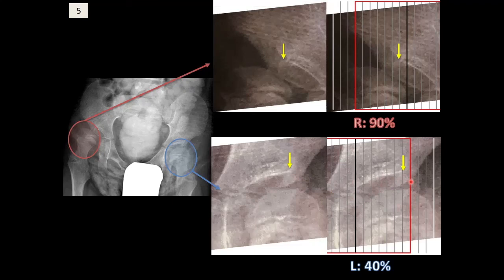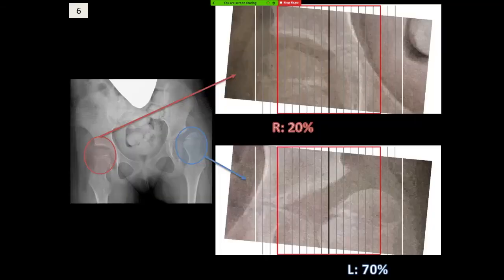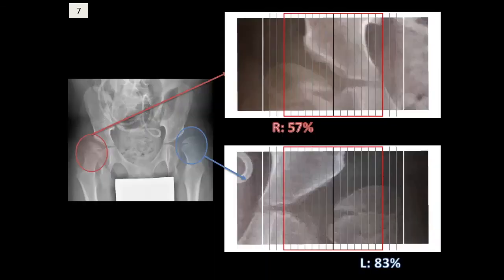The next 5 examples, I'm going to just breeze through with showing you the X-ray and then showing you the answer. And I'll leave it to you to take the time to do the measurements. So here's image 6 and the suggested answers to image 6. X-ray 7 and the suggested answers to X-ray 7.